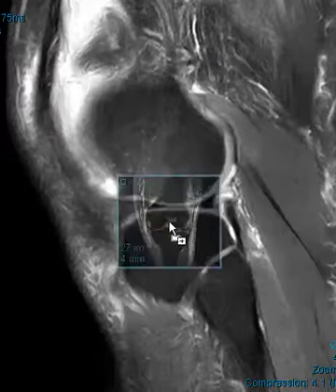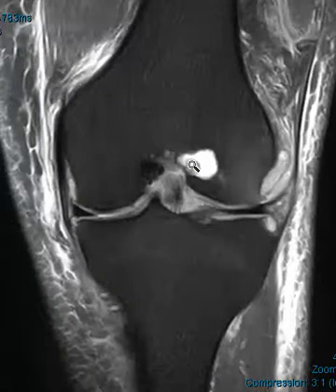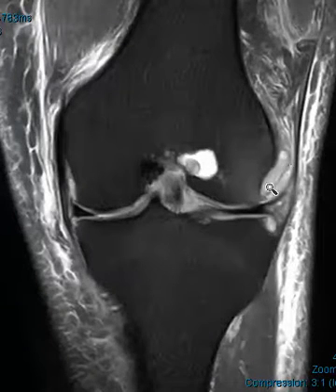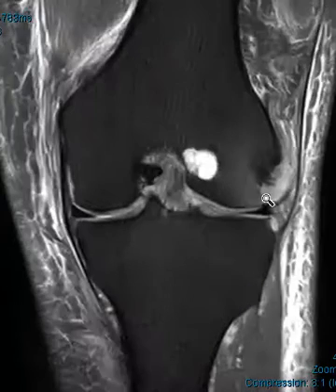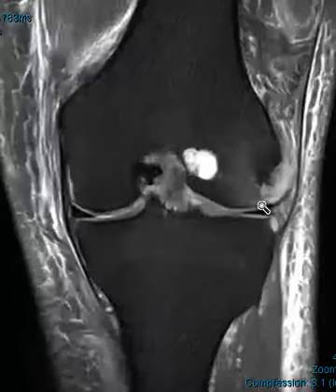So if we put up the coronal view to look at that, we see that the ACL is thick. We see that cystic erosion there with a little funny area of intermediate signal within it. And we see this gray fluid, this synovial inflammation out here on the lateral side, and this looks like it scallops the lateral aspect here. So it looks like a chronic bone erosion, and this funny process here that's eroding chronically here, causing that faint marrow edema, little bony spur down here.